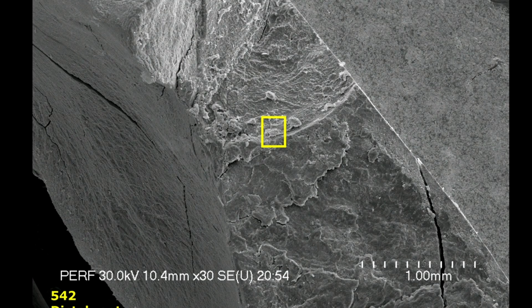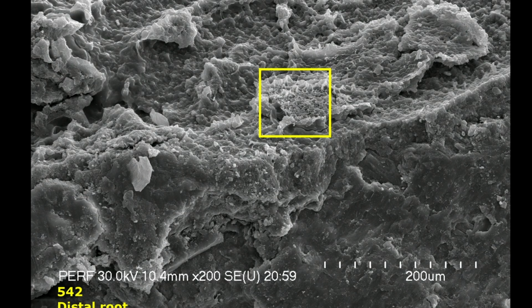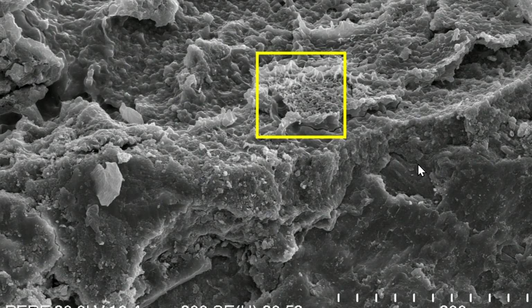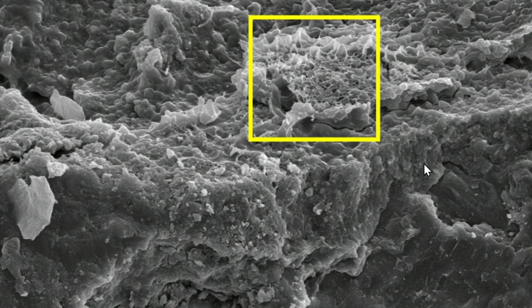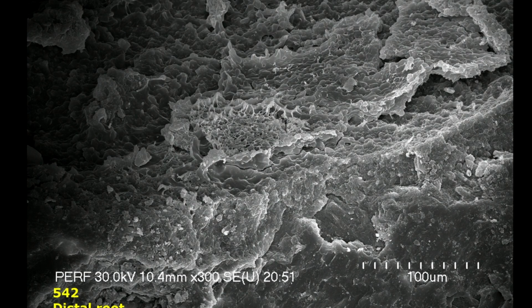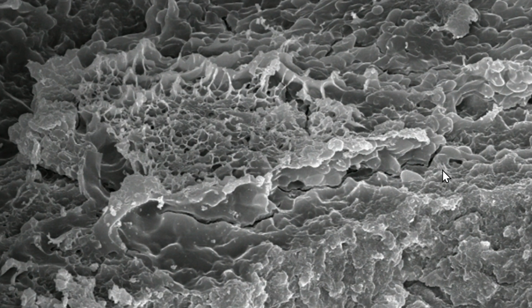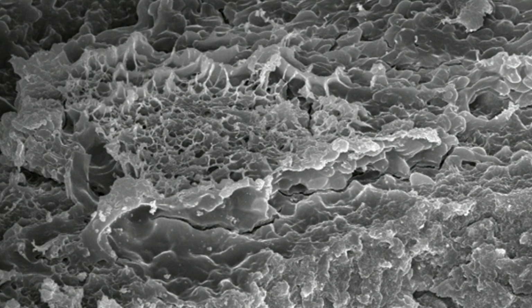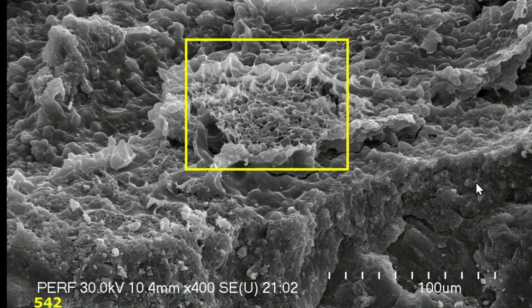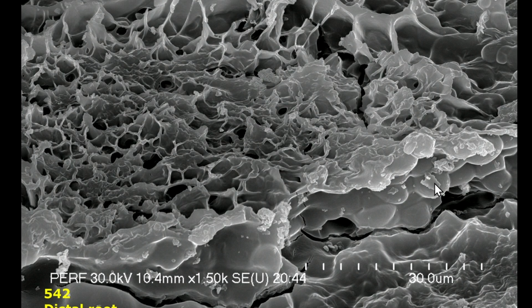So when you look at where the fracture actually enters into the distal canal, and then you go ahead and look at how those biofilms appear, you get a sense for the kind of structures that they make. So you have a lot. Now this has been separated, so it's been torn open when we fractured the tooth to look at the axial wall. But you can actually see these biofilms make a kind of structure.